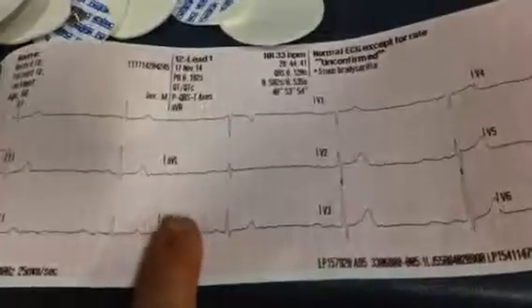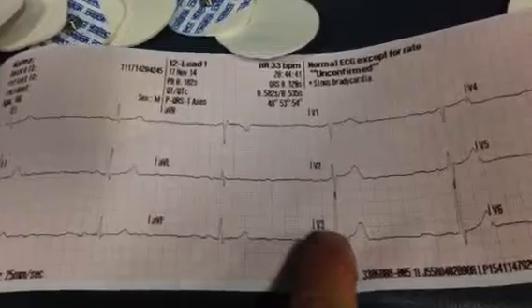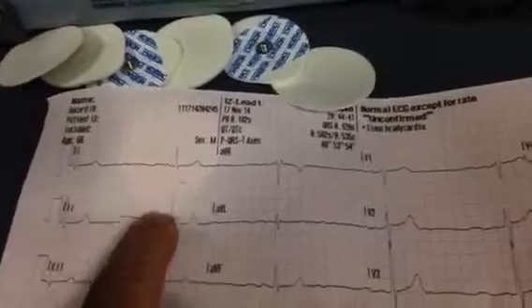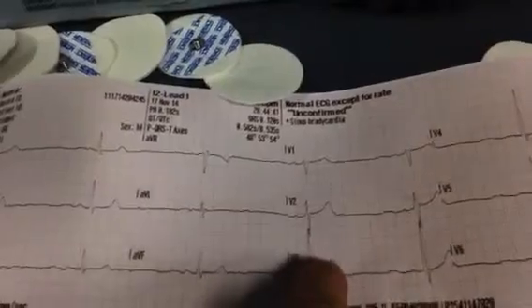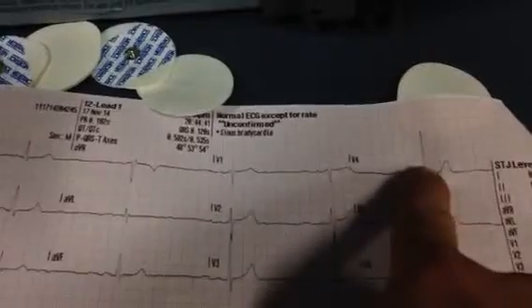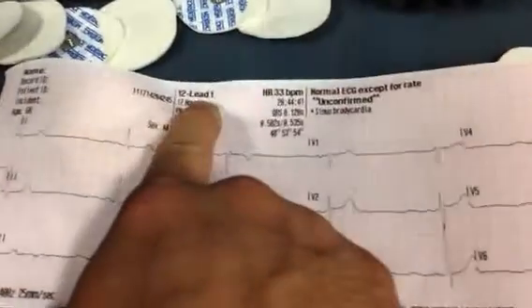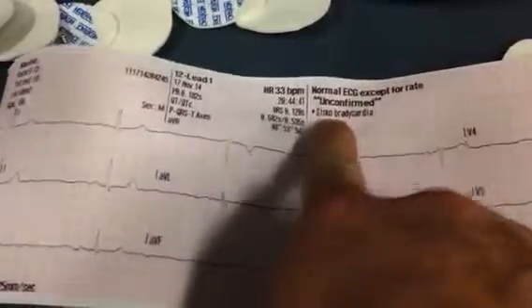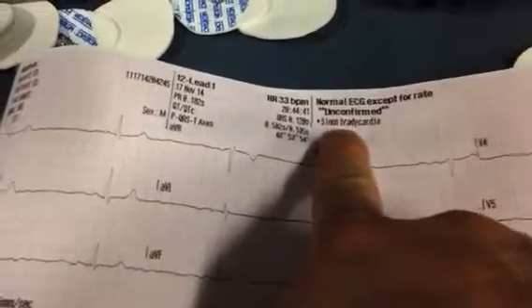and using our squares, as in our earlier lessons, to measure the distance from the QRS complex to QRS complex. In this 12 lead, we note that the QRS complexes are consistent in all leads V1 through V6 with a consistently shaped T wave. We also note at the top, Life-Pak 15 has generated 12 lead, the number 12 lead, which number 12 lead it is, as well as giving us an unconfirmed normal EKG stating unconfirmed diagnosis of sinus bradycardia.